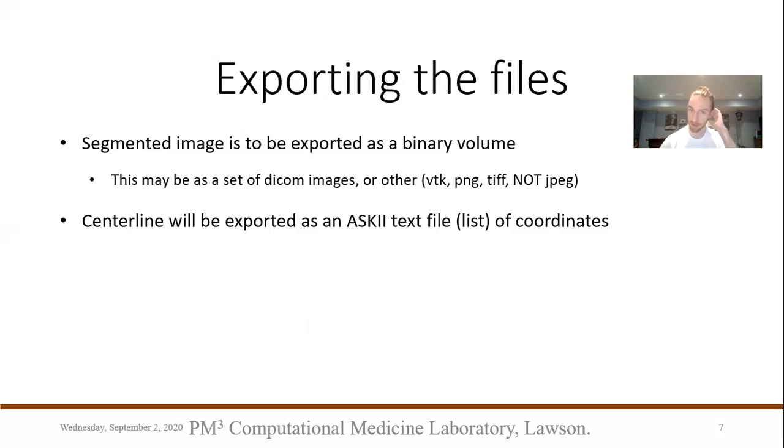And finally, exporting the files. Segmented images should usually be exported as a binary volume. This may be a set of DICOM images or another format such as VTK, PNG, TIFF.